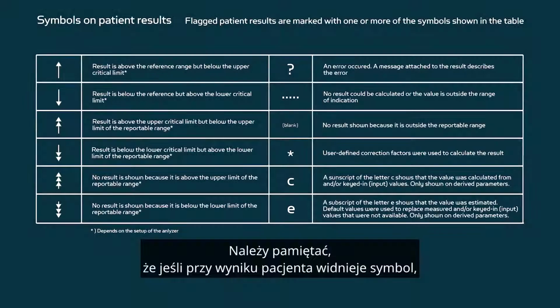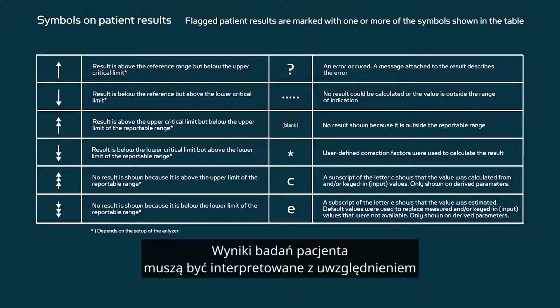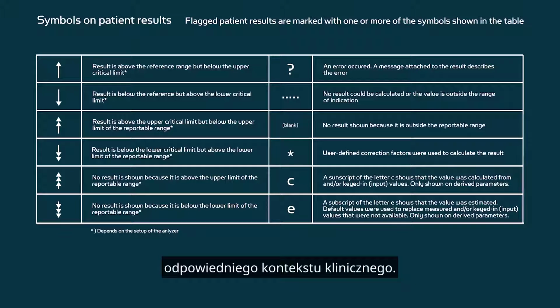Note that if a patient result is marked with a symbol, there may be a risk of making an incorrect clinical decision. Patient test results must therefore always be interpreted in the relevant clinical context.